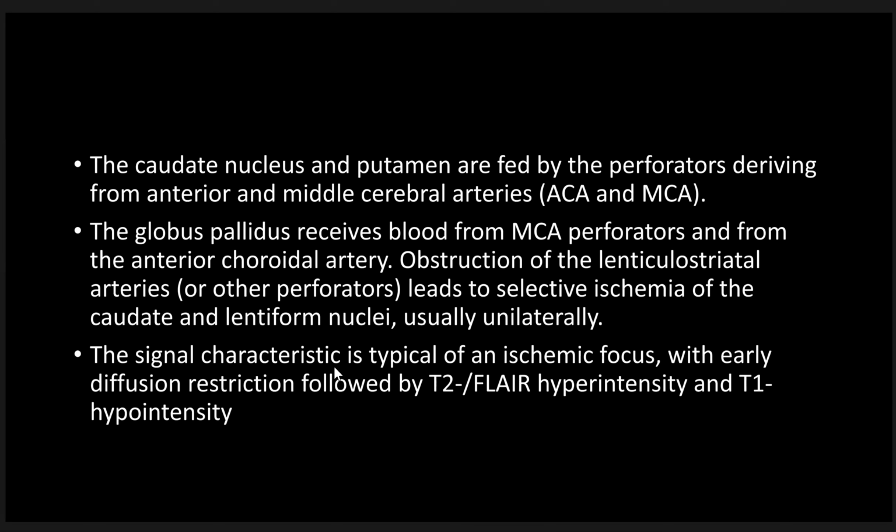The signal characteristics are typical of an ischemic focus with early diffusion restriction followed by T2/FLAIR hyperintensity and T1 hypointensity.